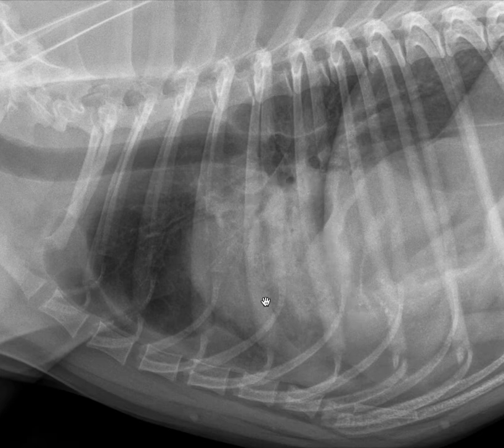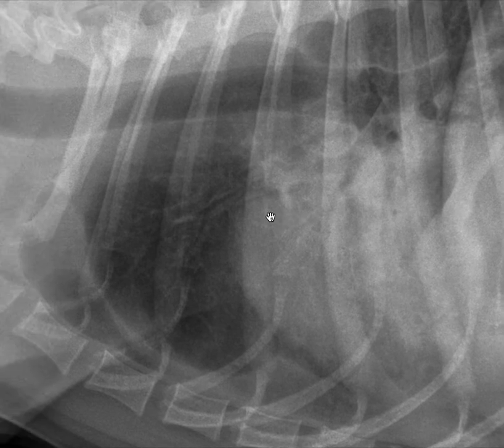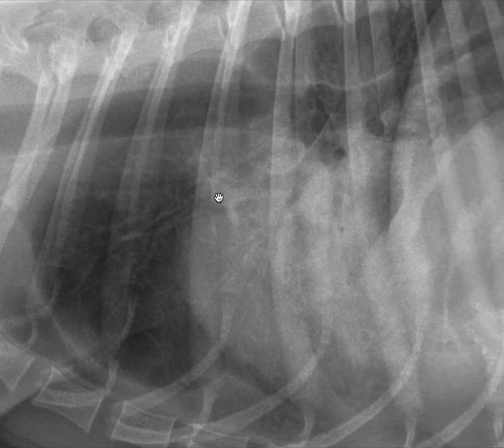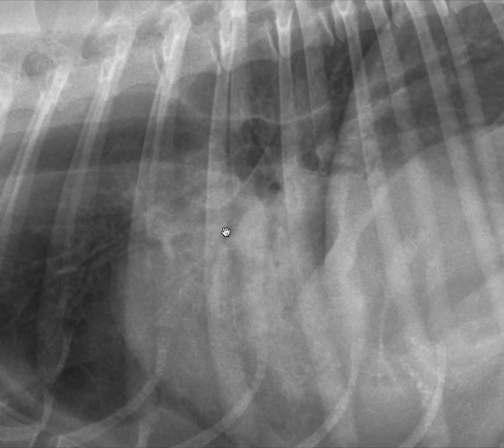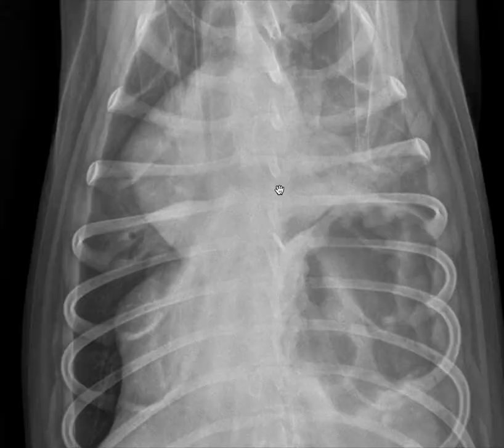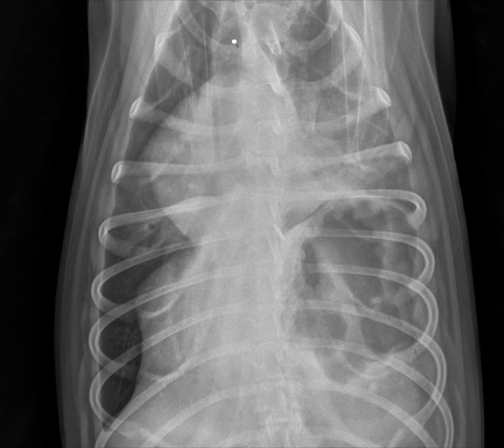Continuing on from the pulmonary findings, I would then look at pulmonary blood vessels and the airways. The cranial lobar vessels are best assessed on the lateral view. When I trace them, you can see that they're actually quite small. This is also detected in other lung fields, but is less apparent because of the concurrent pulmonary pathology. Looking at the airways, and I'm going to go back to the other view to show this, when I trace the trachea to the mainstem bronchi, I can see that there's cranial displacement of the left.